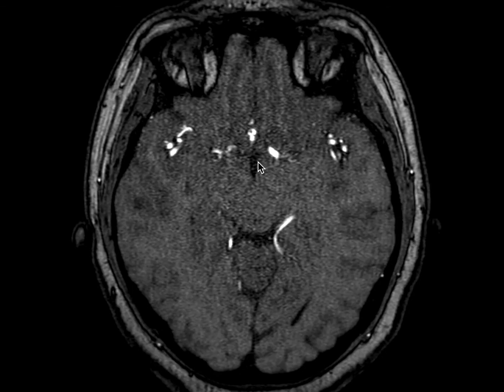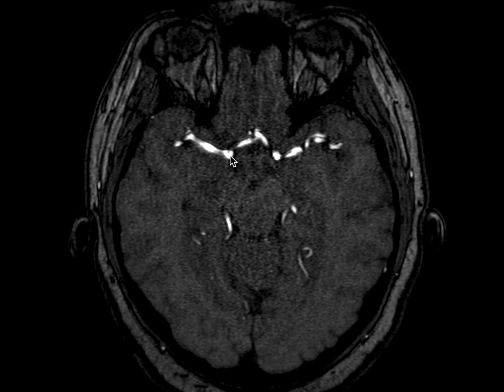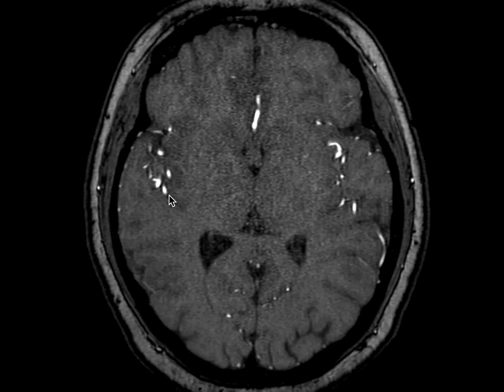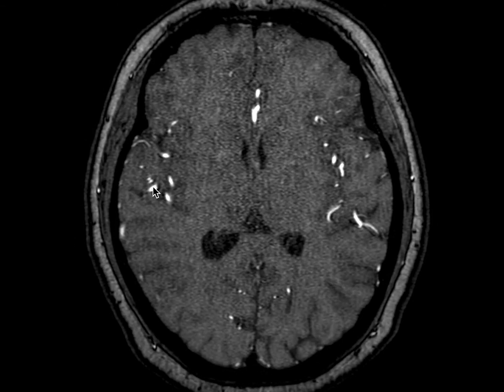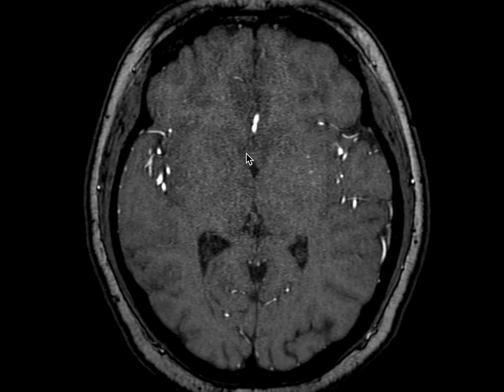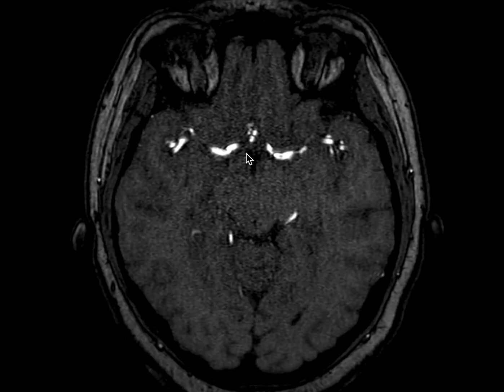I'll scroll back down inferiorly now and point out the internal carotid artery terminus right here. It is from this point that the middle and anterior cerebral arteries arise. Following our M1 sphenoidal segment, we can watch it reach the anterior aspect of the insula, or bifurcation point, where it becomes the M2 segments. These will go up posteriorly and superiorly until they reach the top of the sylvian fissure up here, and then turn out laterally to become the M3 segments, whereupon they exit at the insular cistern to become the M4 cortical segments.